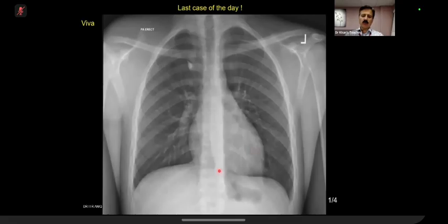Last case of the day, and this is a beautiful film for the same reason. It's an observational film, classical 2B. 466 people are still with us. If all of you can concentrate on this.